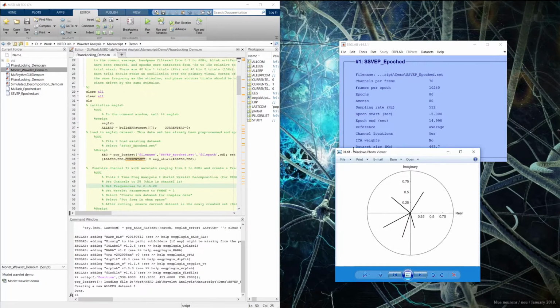How we'll measure this here is by first convolving the signal at a particular frequency and collecting the complex output signal. Then, in all 6 Hz trials, for example, we'll collect the complex vectors at a particular time point in each trial. And let's say that this is a plot of all the complex vectors collected at the 100 millisecond time point in each trial. In reality, there would be much more, obviously.